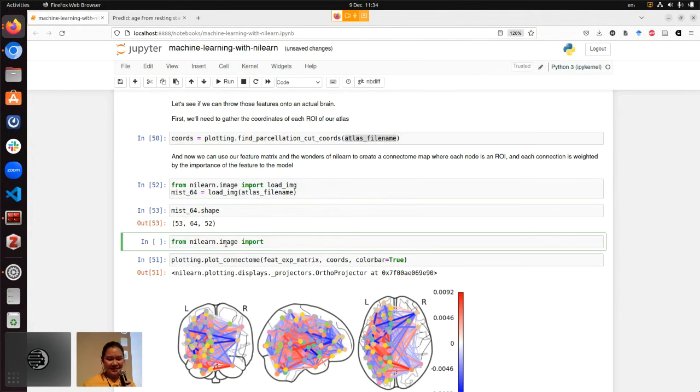I didn't know that if it's ROI number 1, it will have voxels with the value 1 in it, and you can filter on that. What I did in the past was use another software to break down all that information and then load it again. But you can actually do it all in Nilearn.